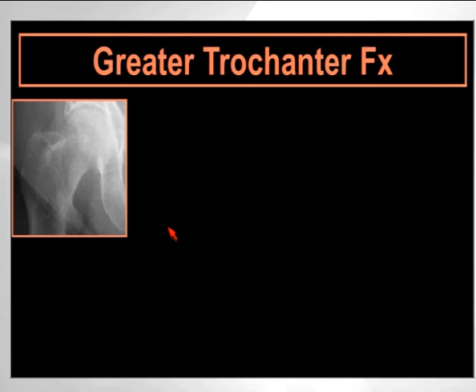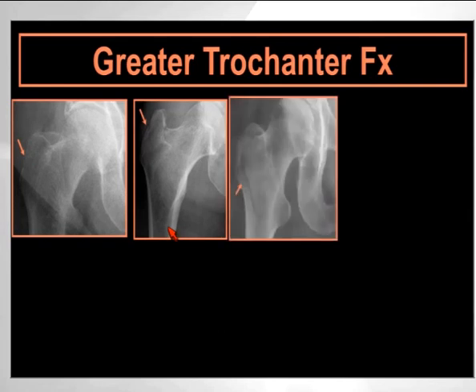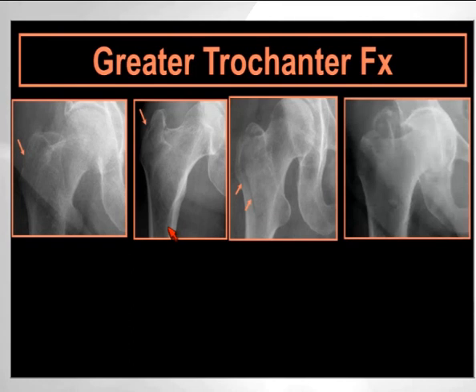This can be very hard. Here is a non-displaced fracture, and again, you have to look for this fracture. This will not jump on you. Here is another patient with more comminution, slightly easier to see. Then this fracture where there is extension. If you have extension, again, you would not miss it. And if there is displacement, easy to see.